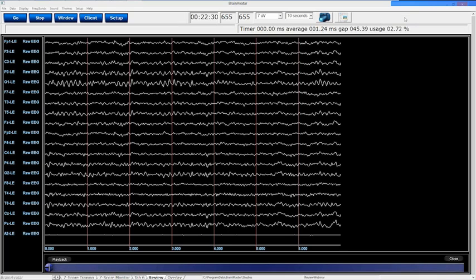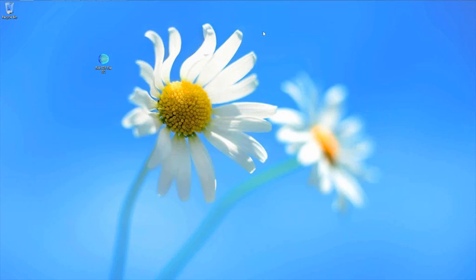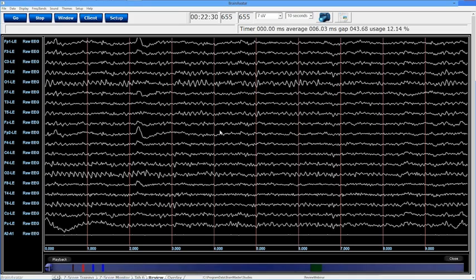So the power of this is that it's very flexible. You now can basically look at choice pieces of data and play back only those bits of data and really review what you really want to see out of some information that you got. So let's go back to this raw EDF file. Double click it. I'm going to open it. I'm in my review area.